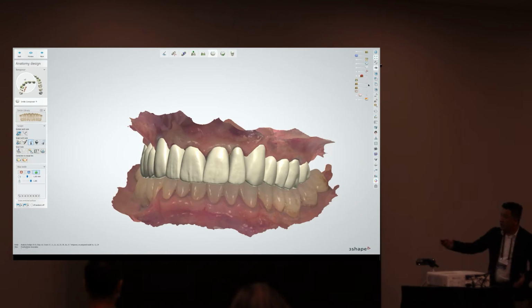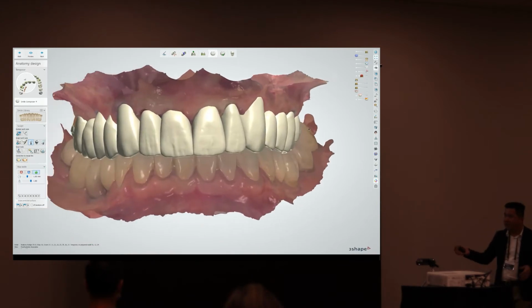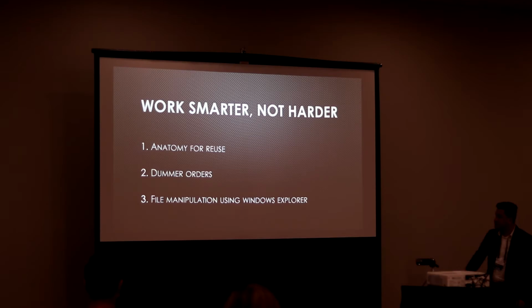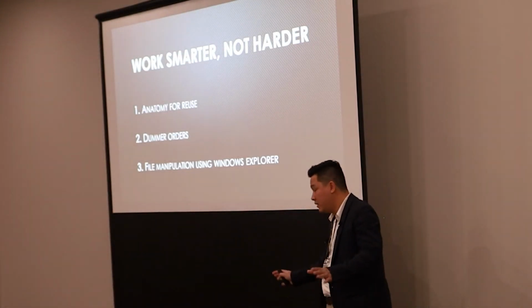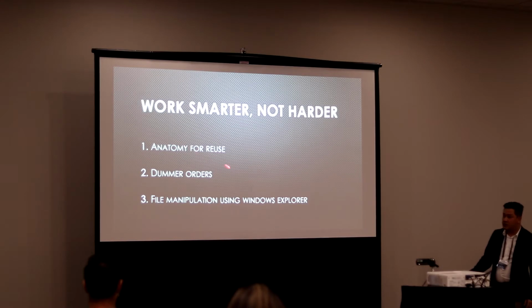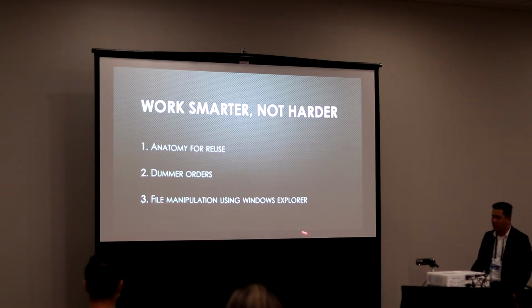So what we're going to show you today is how we're going to copy and paste our original designs into this. So number one, you're not making these sad copies. And number two, it's a much faster, more efficient way of doing these things. So work smarter, not harder. So the concepts that we're going to go over are, of course, anatomy for reuse, dummy orders, autocorrect, file manipulation using Windows Explorer as well.